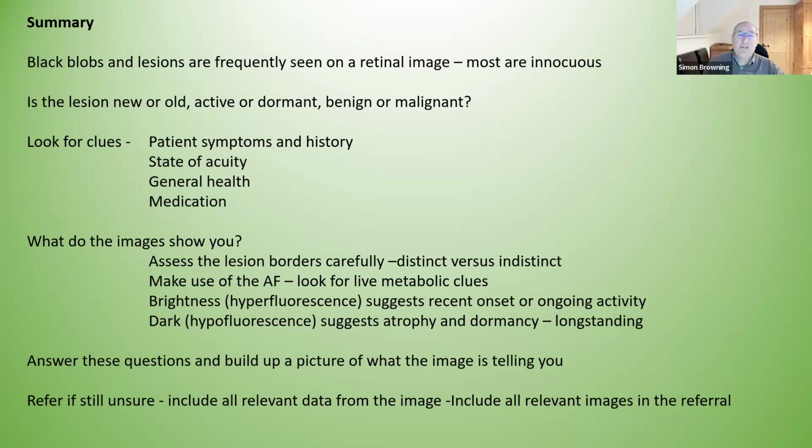So answer all these questions, build up a picture of what the image is telling you. If at the end of all of that, you're still not sure what's going on, then obviously you need to refer that patient, but include all the data. Please do include the images and include the data and your thinking within that referral.